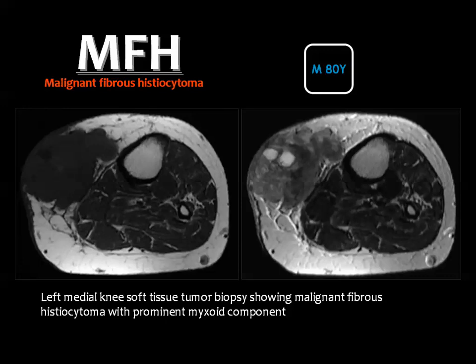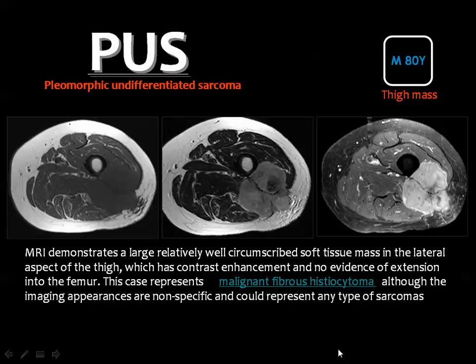And you see in the T1 and T2 weighted images, a big soft tissue mass involving the subcutaneous fat, and you cannot see a specific criteria for this lesion unless you may be able to say that this is malignant because of the invasion of the surrounding and then the poor definition of the margin, for example.